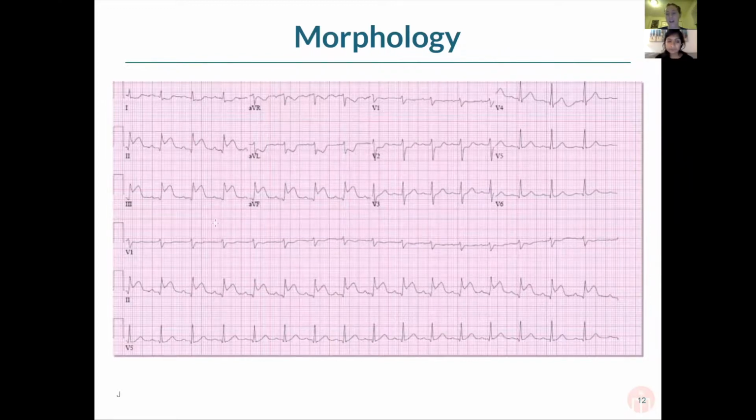And one of the classic things that they like to test on is, does anyone know, if you saw this patient with an EKG and they're having chest pain, what's the classic medication you would want to avoid and not give a patient with an EKG like this? If anyone has an idea, throw it in there. That might be something else that they would do. Yeah, people are already saying it, right? Excellent. Good, nitro, yeah.